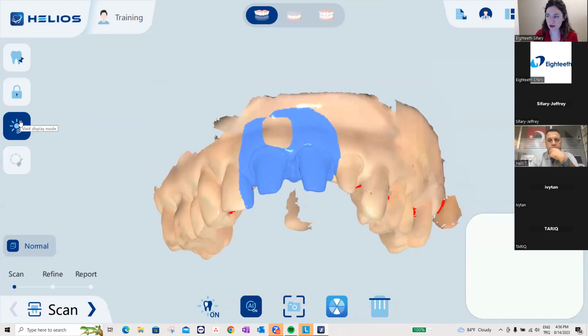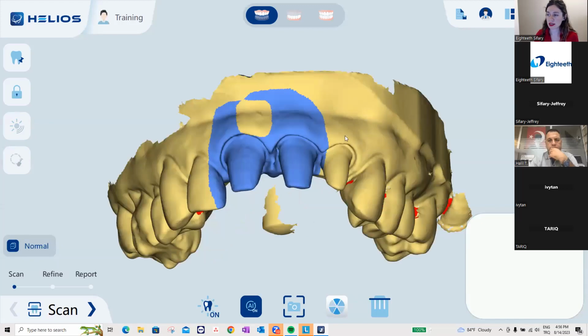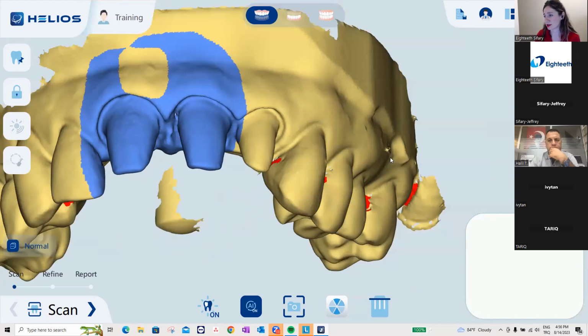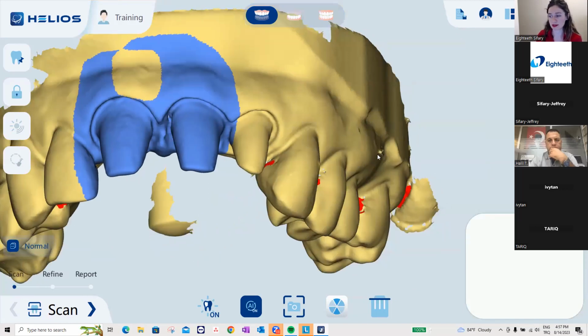There is vivid mode, there is normal mode, and if they click the color mode, they are able to see in the yellow color, which is sometimes we are able to see better in a contrast value. That's why, because sometimes you cannot see these types of areas, okay?